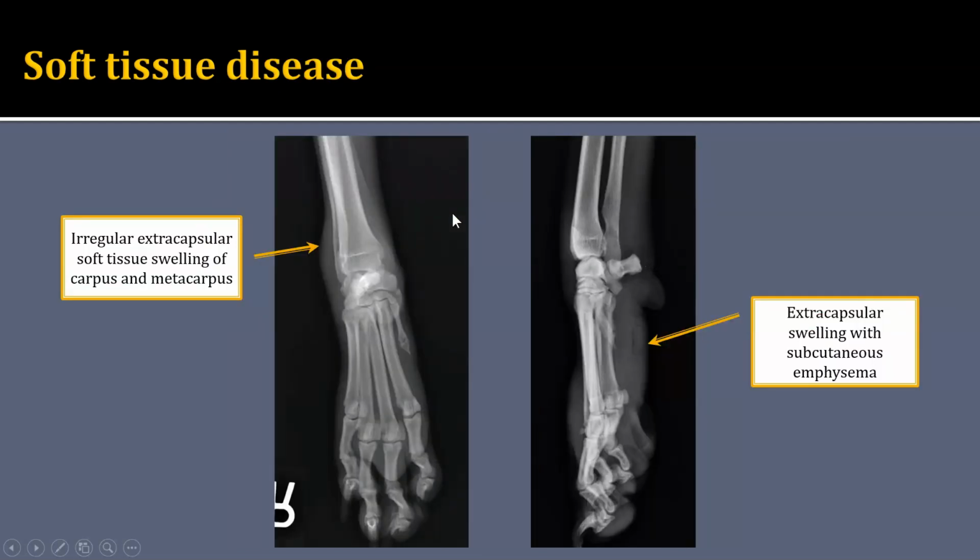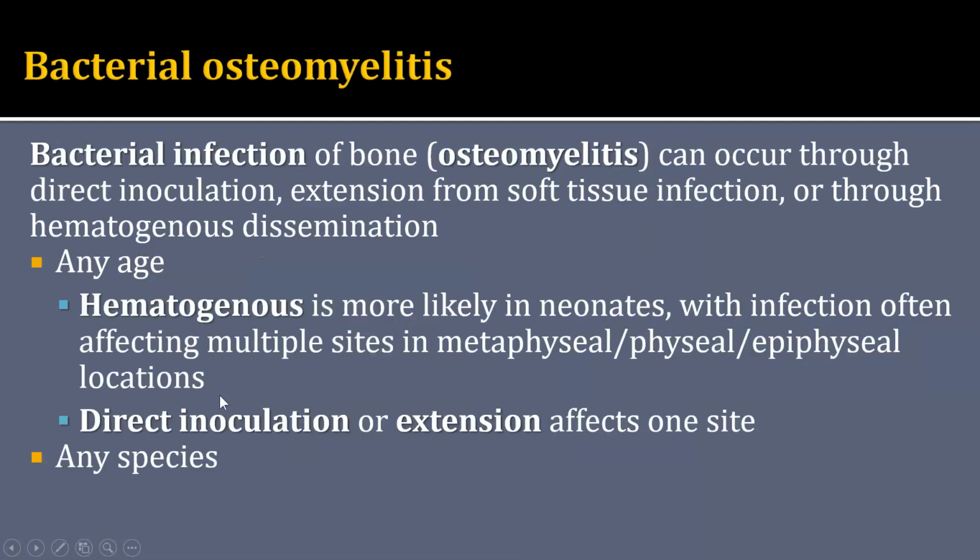Here's a dog that's presenting with distal limb swelling after trauma. And we can see that there's quite a bit of soft tissue swelling that is around the distal antebrachium, carpus, as well as the metacarpus. And then within the palmar soft tissues, we can see lots of little areas of gas, so subcutaneous emphysema. We could look for any foreign bodies. And in fact, some of this linear appearing radiolucency could potentially be a radiolucent stick that is embedded, and so we may need to assess further with, say, ultrasound to look for foreign object. But then we may be able to identify actual bone involvement through infection.